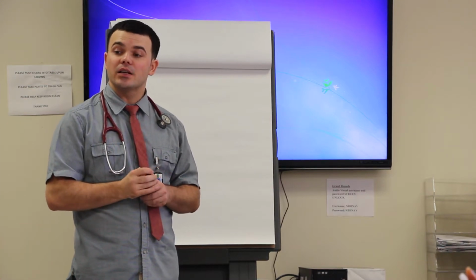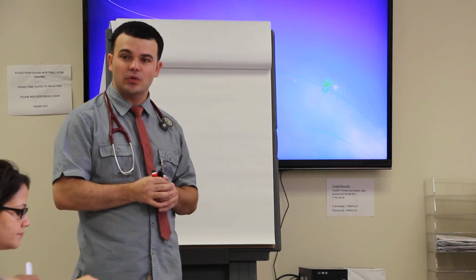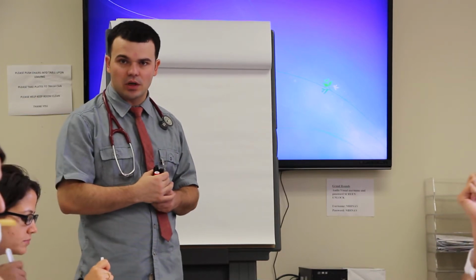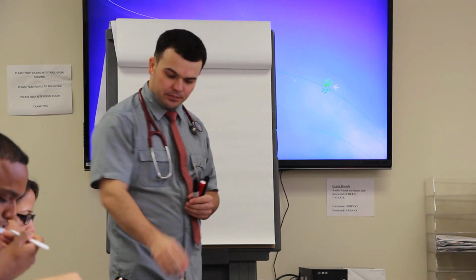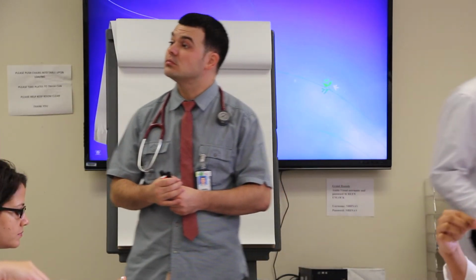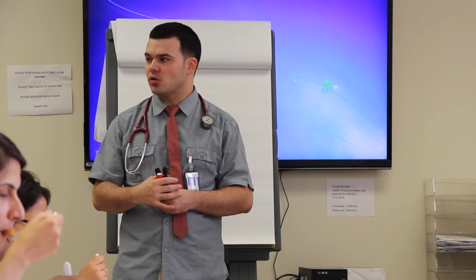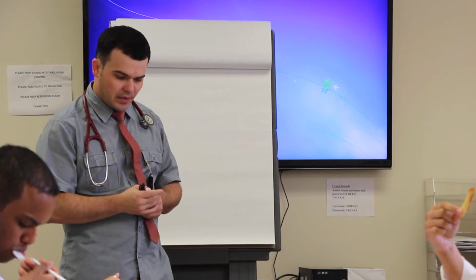Identification, right? You've got to make sure that the demographic data you have in front of you on the EKG is for the right patient. Don't go straight into calling whatever diagnosis you want on EKG. And the second? Standardization. You make sure that whatever standardization or default settings are there, you don't overread voltages or duration of the waves, right? Okay.